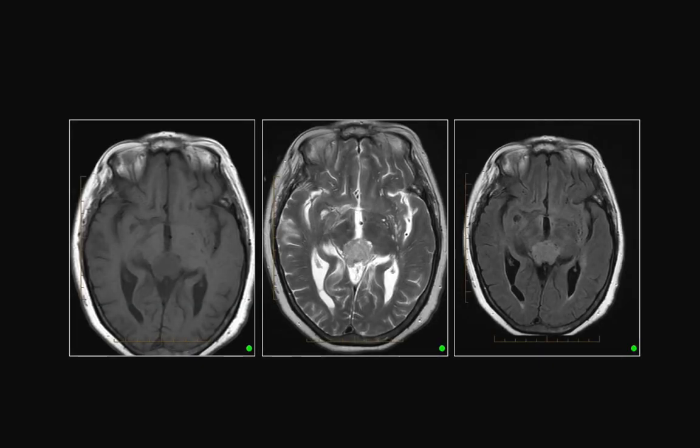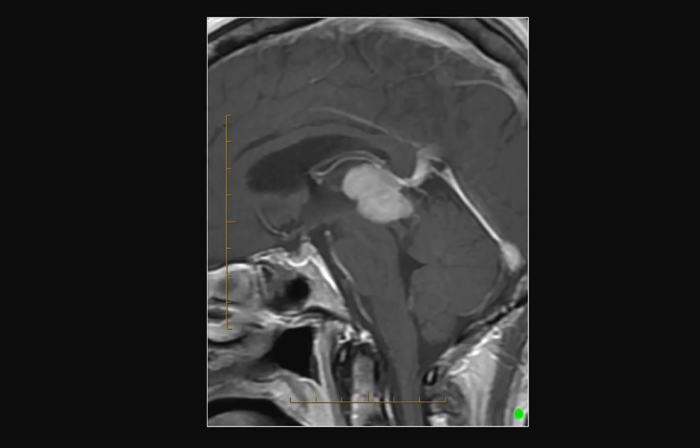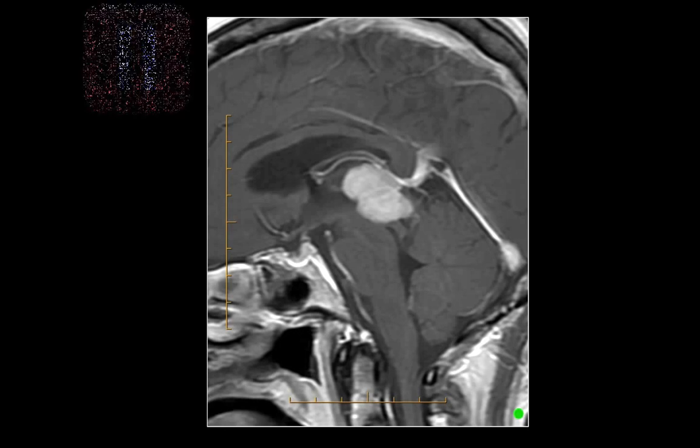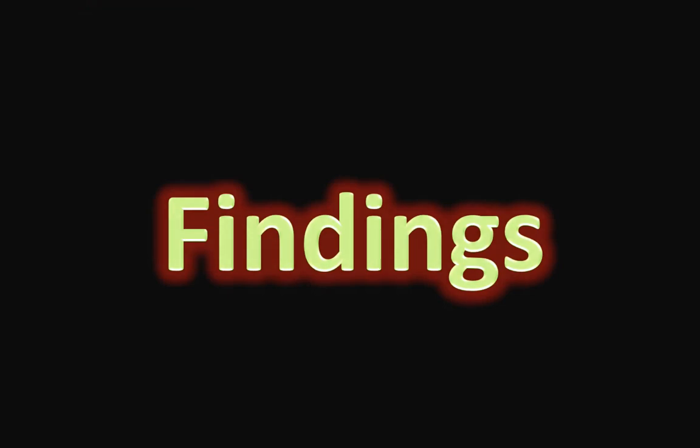Let's go to more images. These are selected MRI images on the same patient. Pause here. This is another image as well. Pause here. Let's go to the findings.